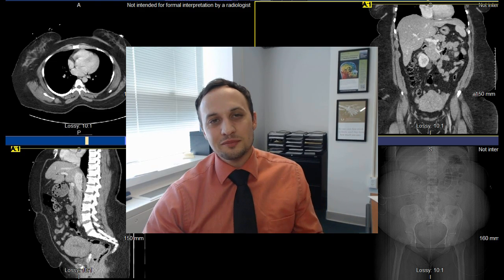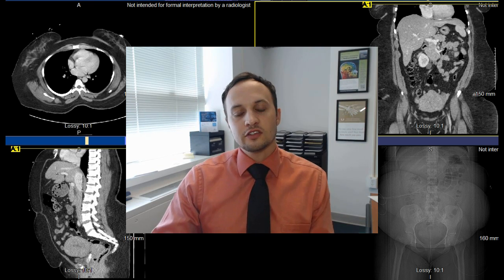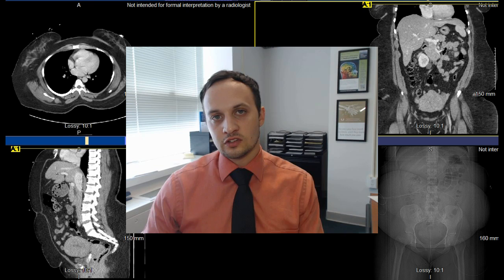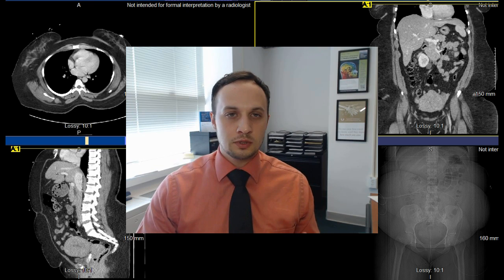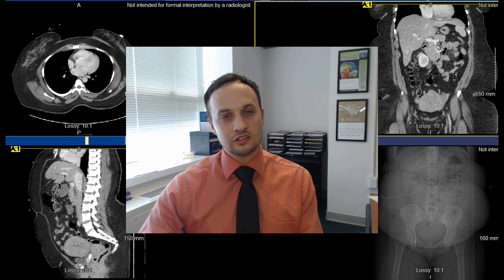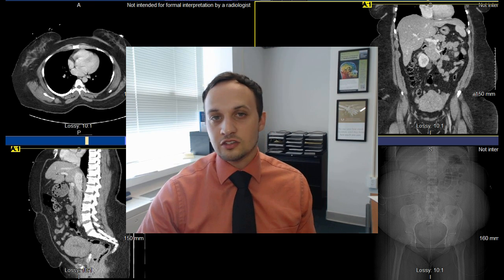In today's video, we're going to be covering the anatomy of the female pelvis. We'll go through all three imaging planes this time around, just so you can see some of those differences as you transition from the axial orientation to the coronal orientation, and how you can start to see some of the structures a little bit better, especially if you're struggling with some of them. Utilizing some of those alternative planes can help put us in check and demonstrate some of those structures a little bit easier than others.